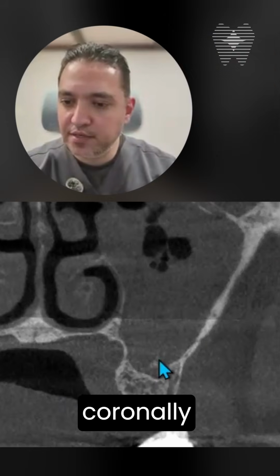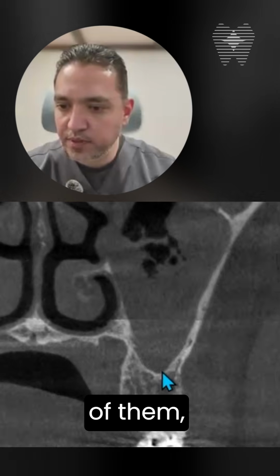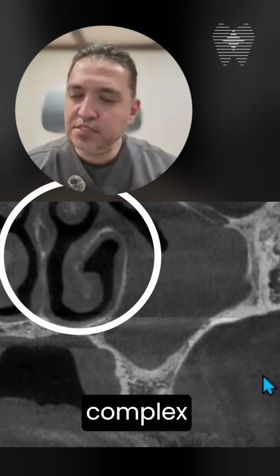When we look coronally, you can see more of them, and we can see multiple air bubbles at the superior half of the maxillary sinus. The ostiomeatal complex is most likely narrowed or even partially blocked. These air bubbles are an indication of acute inflammatory changes.